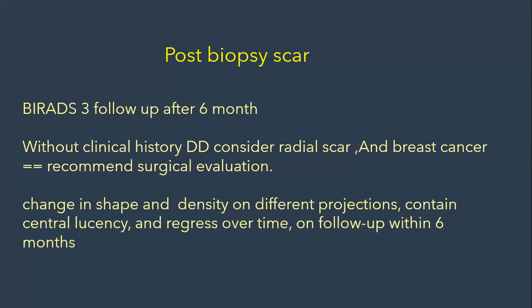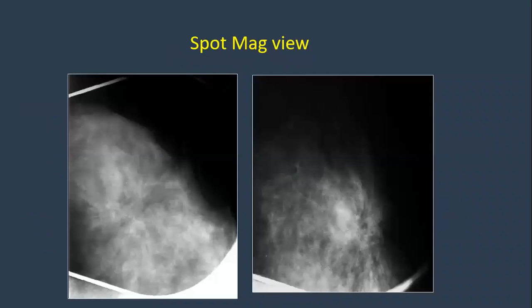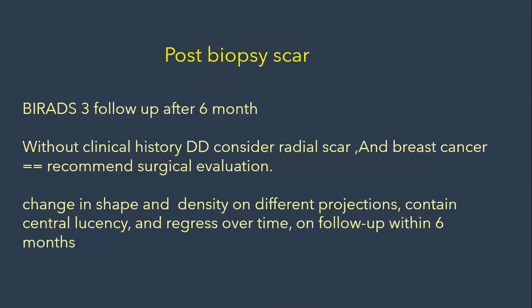Okay, without clinical history, the differential diagnosis, if you have no history of post-intervention, you will code it as BI-RADS 4 for biopsy. The differential would be radial scar, or malignancy. It can still be invasive cancer or radial scar. So you are going to do biopsy.